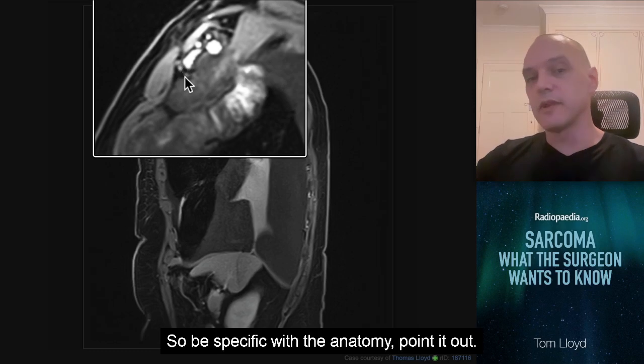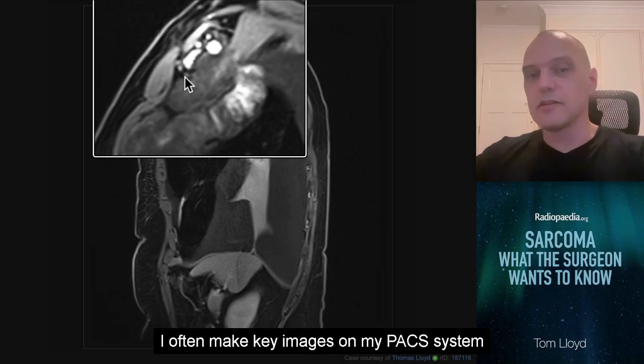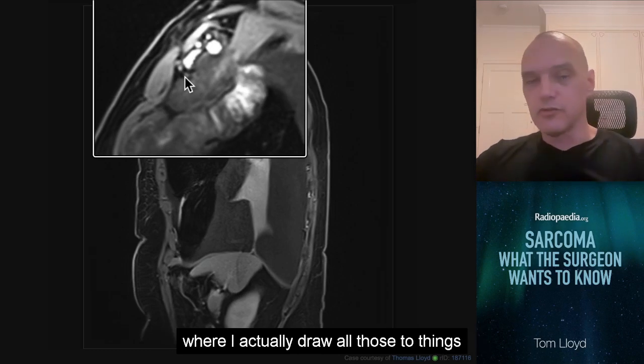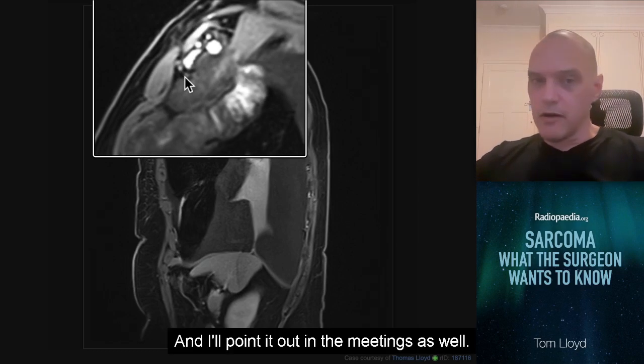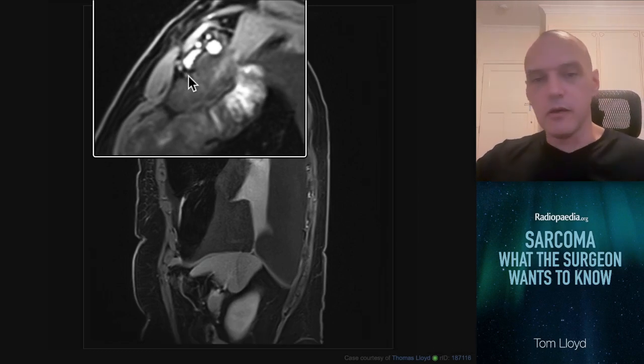So be specific with the anatomy. Point it out. I often make key images on my PACS system where I actually draw arrows to things and say, this is what I'm talking about, and I'll point it out in the meetings as well.